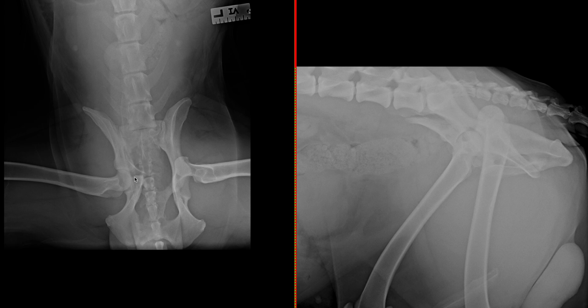Another fracture bisects the right acetabulum. This creates a segmental component of that right ileal body and cranial acetabulum. Overall, these components are axially displaced, resulting in narrowing of the pelvic canal. The left femoral head is both cranially and dorsally displaced. The margins of the acetabulum and of the femoral head are smooth.